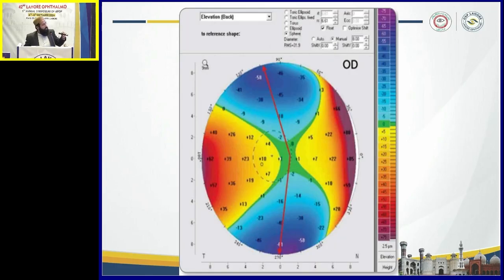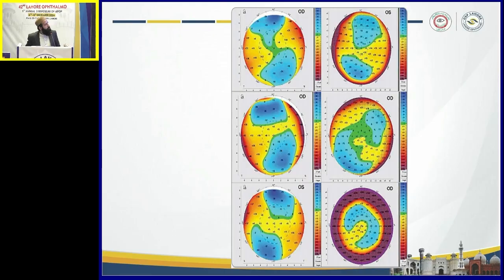This is the superior and inferior and cool islands. These are the hot colors. These are some of the shapes shown on these maps. These are superior and inferior islands, and this is what we call an embryo shape pattern. This is the embryo shape pattern.